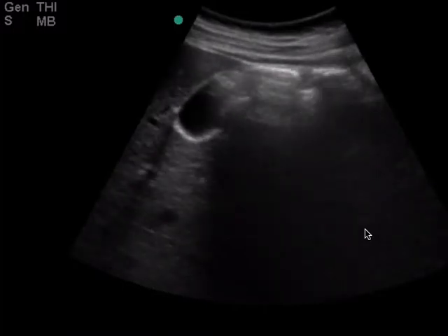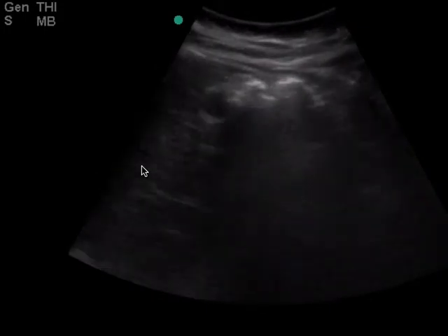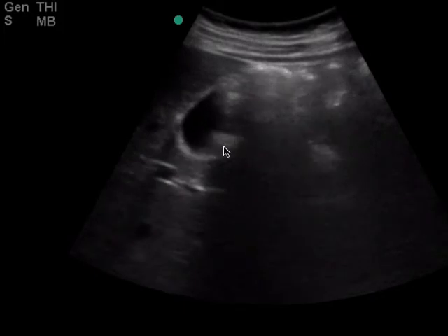This is a right upper quadrant ultrasound with questioned stones, and I think this is the clip where there was a possibility where there may be stones. As you play the clip forward, a couple of things I want you to realize. If you stop it right here, you're wondering, is this maybe stones with shadowing here?